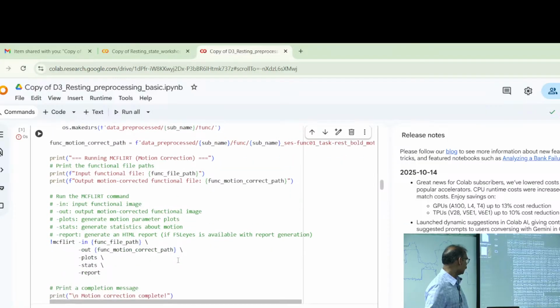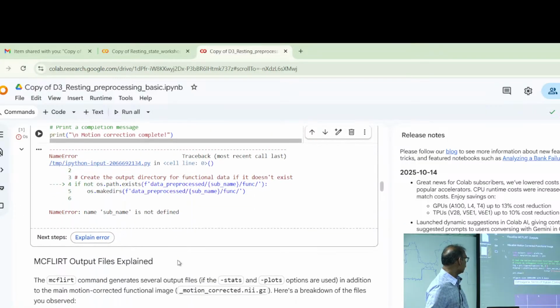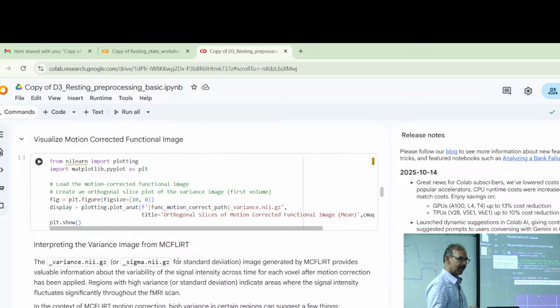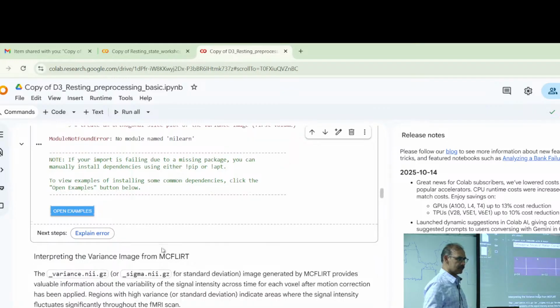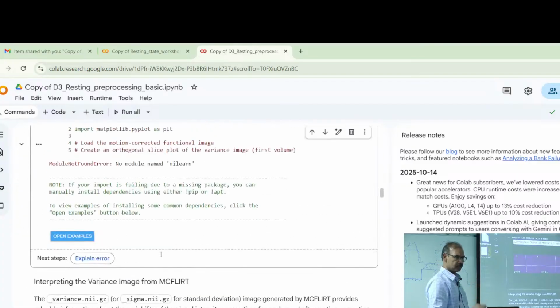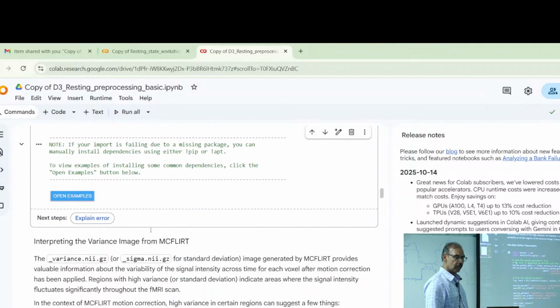Okay, so the motion correction is complete. Now, again, everything we are doing is identical to what we had done for task, right? And here you can see some variation. Obviously, the variation, if there is any, will be along the edges of the brain or large vessels.